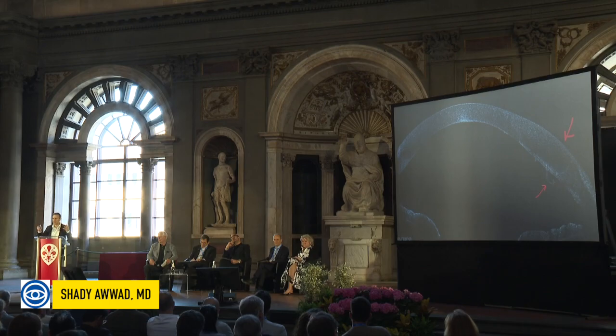This is like looking at axial versus tangential. See, I got the attention of Cynthia here, okay? So axial, smoothing out things, you think things are nice. You look at the tangential, it's kind of archaic, a lot of details. You don't want to look at it, but actually, this is the one that shows you the most details in certain situations.